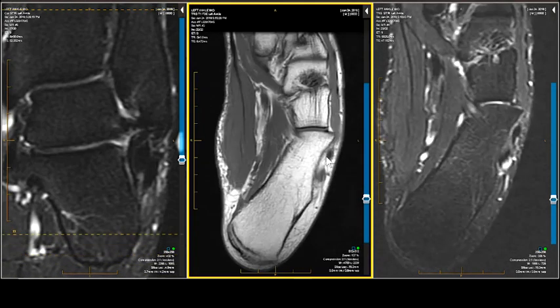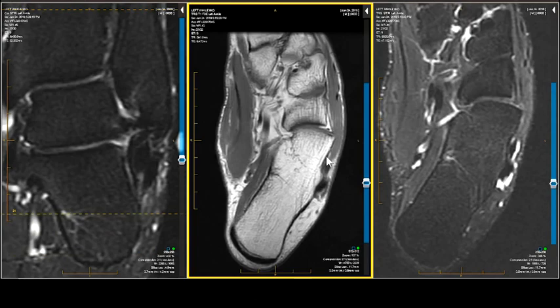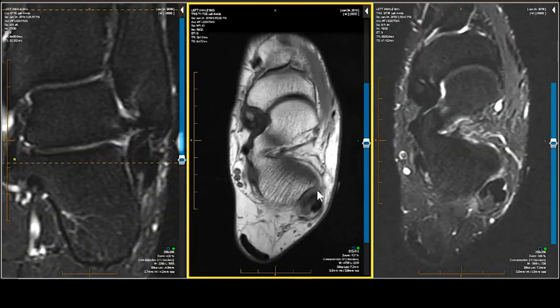So it has a split tear proximal to the os peroneum, which is a site of potential weakness. How would you treat that? You'd leave it alone. It'll heal. What about dislocation of the peroneus longus and brevis?